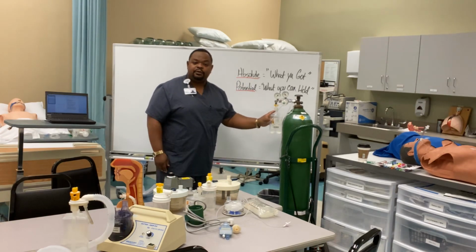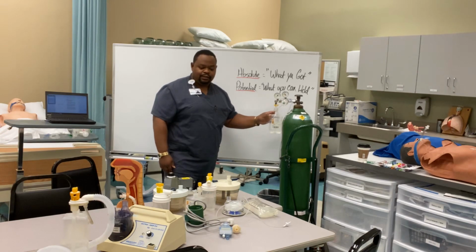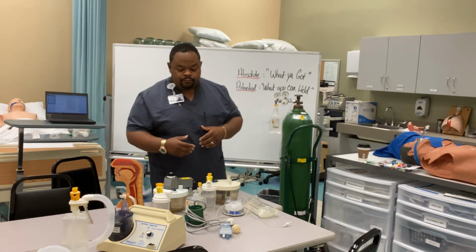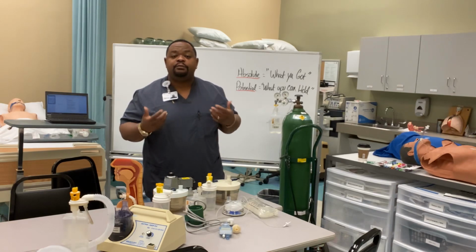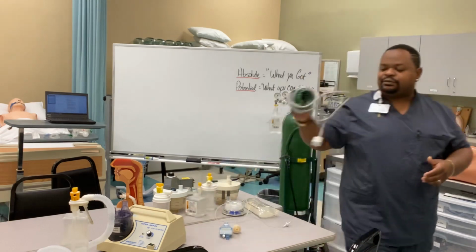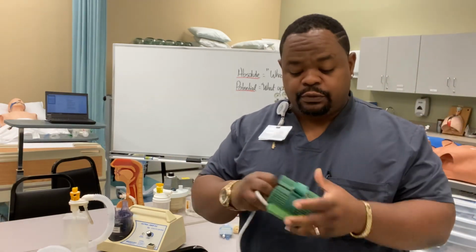This is the bubble humidifier for low flow systems like a nasal cannula, right? This is the low flow device, okay? Low flow humidifier. All right, now let's go into some more humidity and heat, right? This device here is an actual heater. This is a little heater that's kind of old school, but they use them in some places. Remember I told you that you must heat and humidify the gas, right?